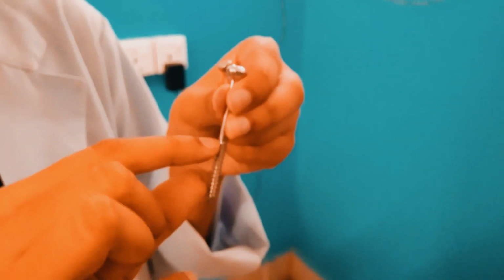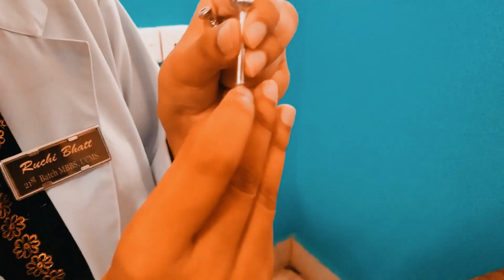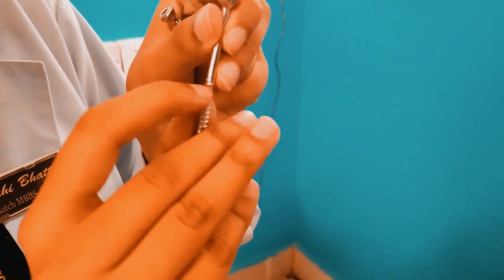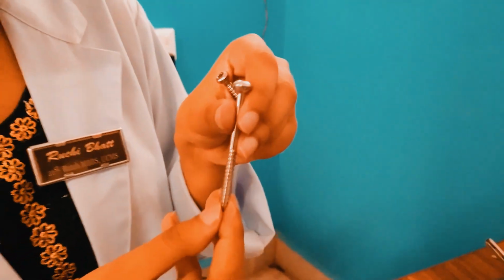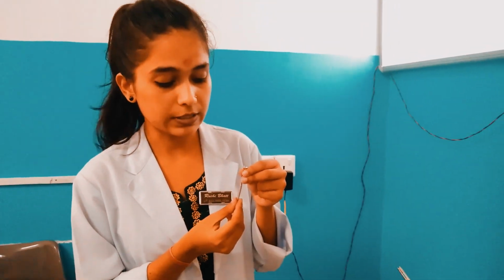And this is our thread. Thread consists of two diameters, the thread diameter and the core diameter. The diameter between the threads is known as thread diameter, and the diameter of the core is known as core diameter. The core diameter decides our bending strength and torsional strength. The more the core diameter, the more the resistance to bending or torsion. The thread diameter decides our pull-out resistance, or holding power. The more the thread diameter, the more the holding power.